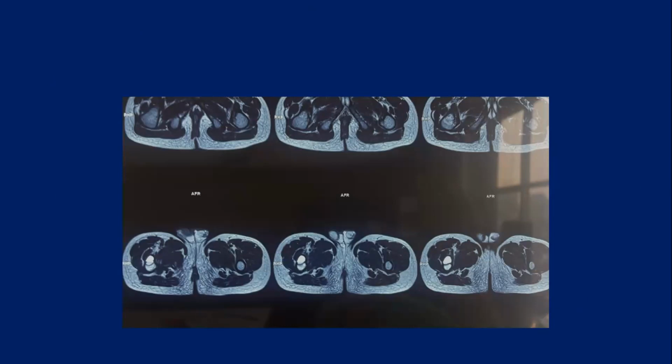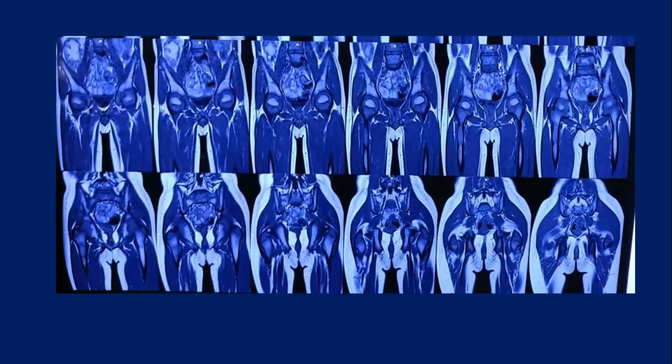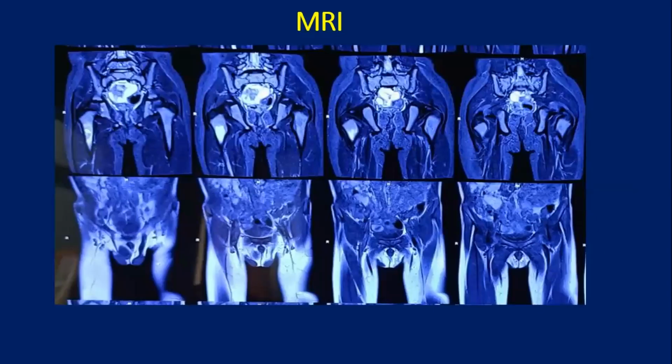Medulla is normal. If you can just go back, was there any marrow edema? One section behind, one more slide. Yeah, there is some marrow edema. I'm not able to see. Maybe we have more axial images which can help us. We can go ahead.